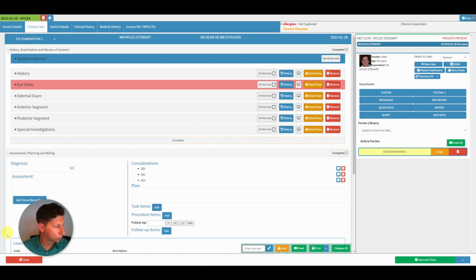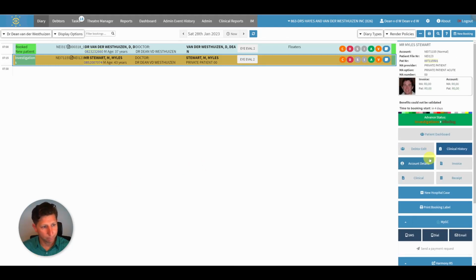I think it's just important to remember that the folder number is obviously critical, and you have to have a unique identifier to be able to identify patients. And so there's a patient number which comes from here. This number is used as a unique identifier, which is in Harmony. So if you search this number, or the patient's name in Harmony, if you don't go via Goodx, you can find the patient there, and this same number will be the number on all your machines.